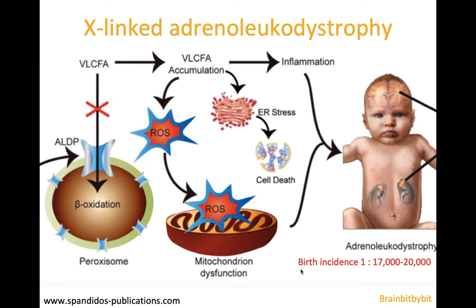I'm going to show images of X-linked adrenoleukodystrophy, which is a problem with the lipid metabolism leading to accumulation of very long-chain fatty acids in the white matter of the brain and in the adrenal glands.